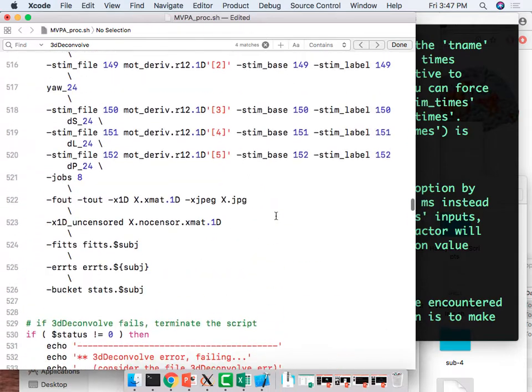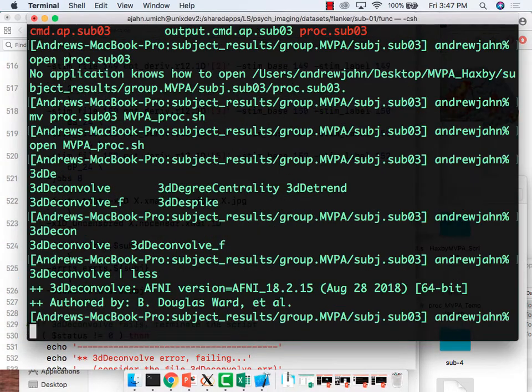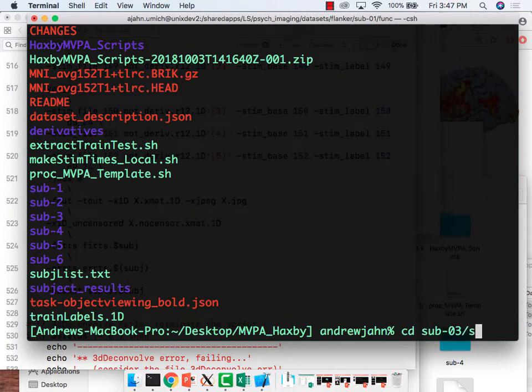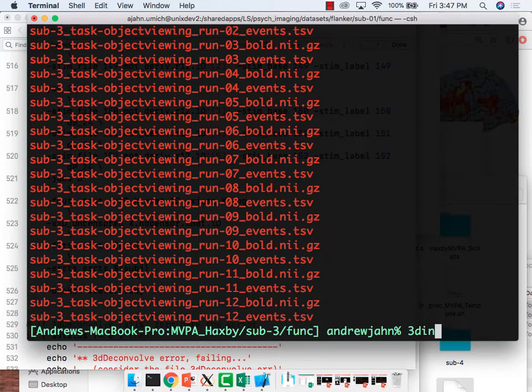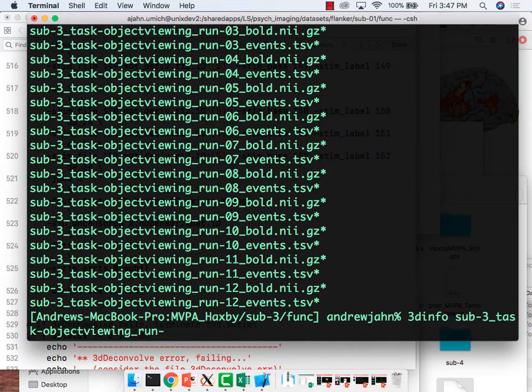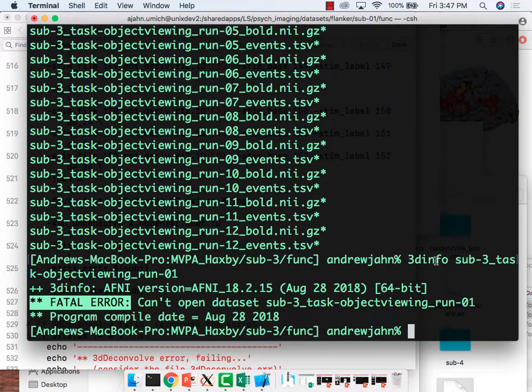Actually, let me make sure we do have enough time points. So 3 func. So 3 task on.